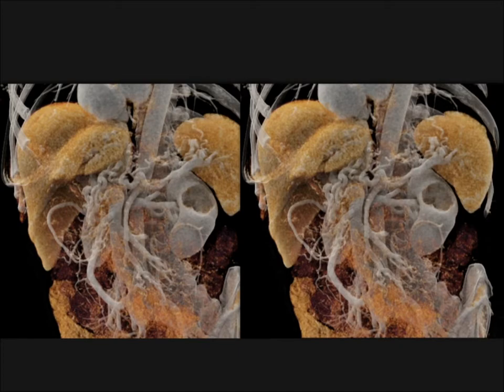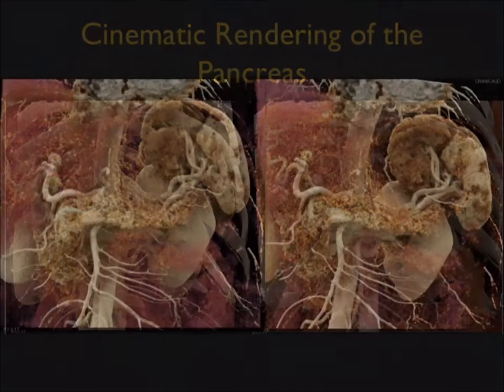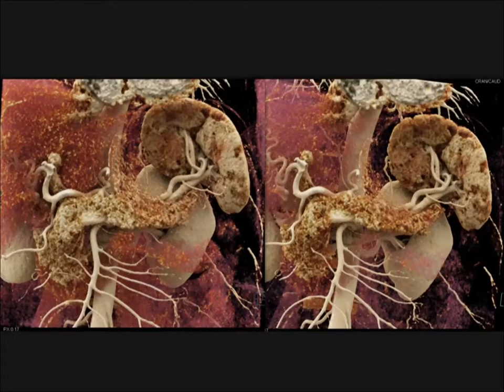It was a patient with pancreatic cancer that was invading. And we talk about texture. Think about the pancreas here and think about the spleen. Linda's going to speak about that, so I won't go into anything in detail. But the fact is, we're able to accentuate. So for detection of pathology, I could look at a data set and be able to roam through the data set.